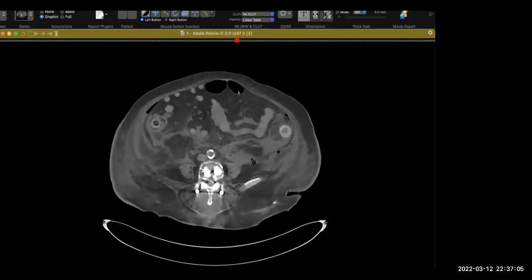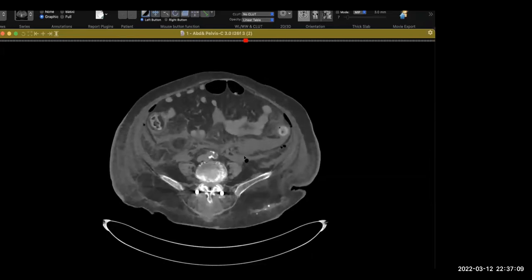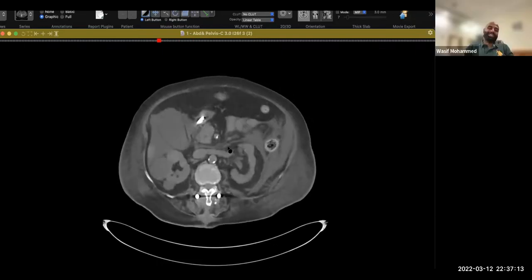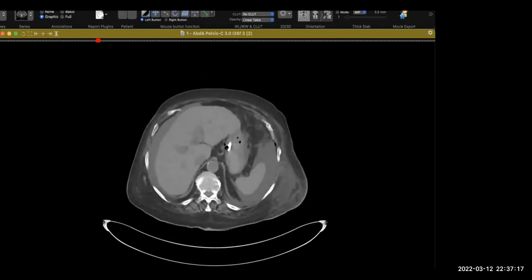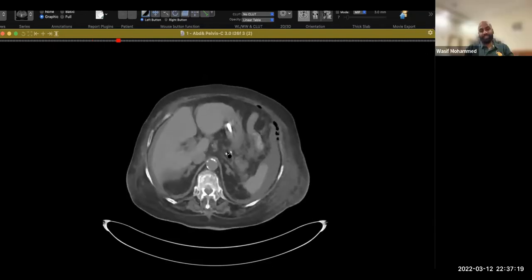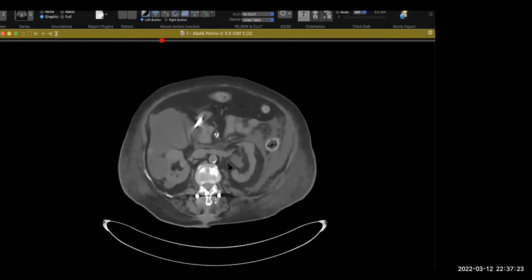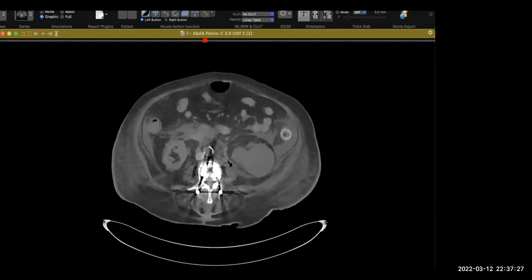Did I tell you in the beginning of the session that no examiner wants to hear about the cyst? I was quite specific, right? No. So just scroll through the images, just see if there is something more concerning. You don't have to talk while scrolling. Just scroll. So I will take a while to scroll through the images and understand what's happening.